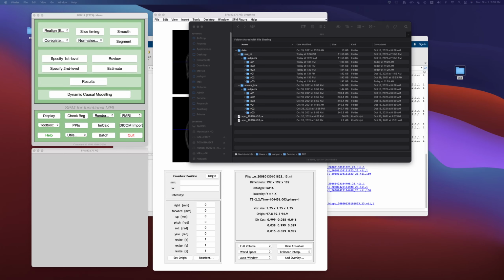We go through the concepts about it in class. So here again, I'm just going to show you how to do it in SPM. Now, if we want to do this step, we just have to make sure that we have gone ahead to process all our subjects in the entire study to the point of segmentation. So that's why we went through the batching script before coming to this Dartel study-specific template step, all right?